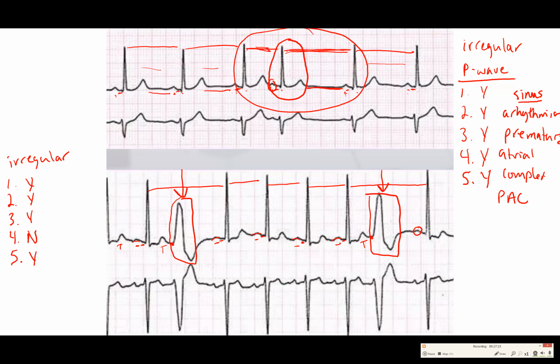We'll also notice, and we'll talk about this more later, this QRS complex is very narrow, maybe at most 2 small boxes, a box and a half. This QRS complex from here to here is very long. So we'd say this is wide. This is a wide QRS, and this is a wide QRS. We'll come to the exact definitions of that in a later lecture, but for now I think you can appreciate just from looking at it, these look skinny and those 2 look wide. Okay, so we have a wide QRS that has no P wave.